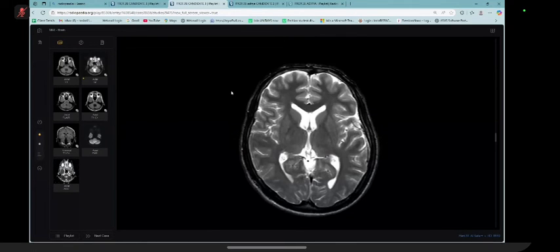What emergency are you going to address first, and how will you manage this case? The hydrocephalus. This is an emergency. I will convey my finding to the neurology team for a shunt for this hydrocephalus, and for MDT discussion for this case and take the appropriate action. Perfect.